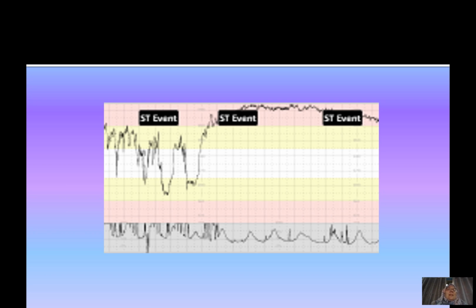At the beginning of the CTG, you can see that, and then you see some deep decelerations. They are not prolonged because they are less than 1 minute or around 1 minute, and then they recover, and then they go down, and then they recover. But they are deep decelerations, and after the third deceleration, you can see that the baby compromises this state with a heart rate of around 180 or even 200.